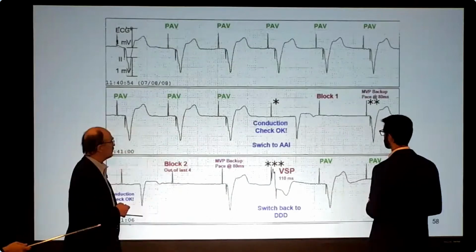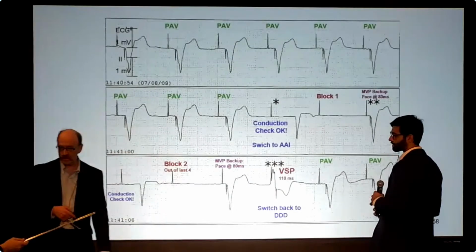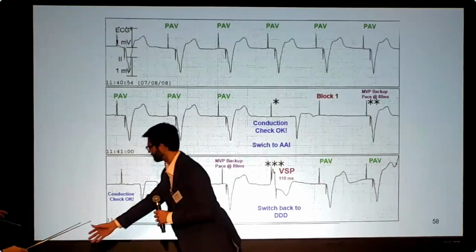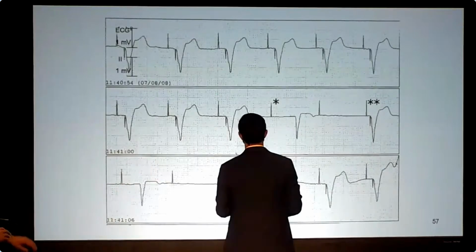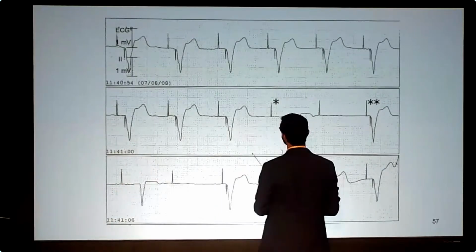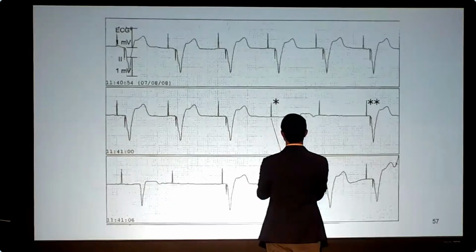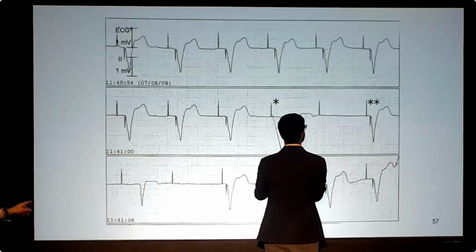So here it is. Can I give you calipers? I mean, you make some measurements for me. Oh, go back. Can you go back? Yeah. Because I'm going to put my foot in this right now. Would you measure the stimulus to QRS on the starred beat? This one here? Yes, sir. Okay. Would you measure the stimulus to QRS down here on the left?